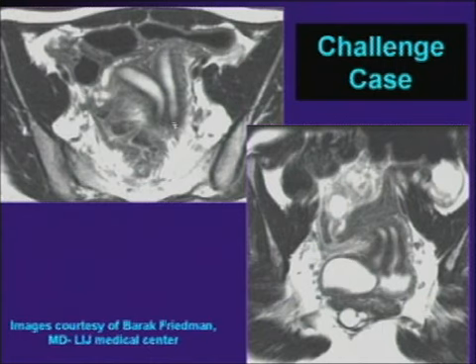But here we see a deep division and appearance of two uterine cavities, and there's this septum between the two. The important thing, again, to note and to fall back on is to get a good view of the uterine contour. And we have one here where we see that there's a slight convexity of the uterine contour, but not significant enough. This is not a bicornate, but a septate uterus with an unusual variation where we have a complete septate uterus. And in addition to that, we can go further and see that there are actually two cervices here and a septum within the vagina.